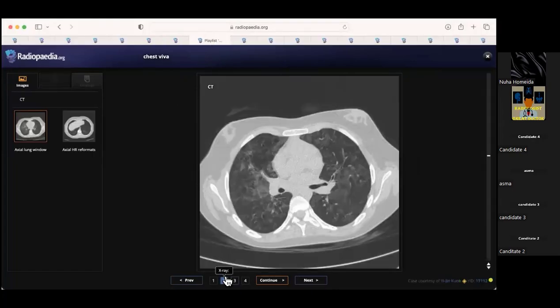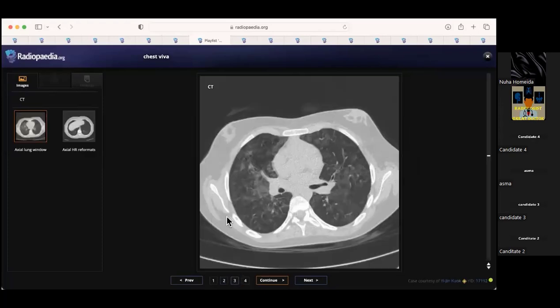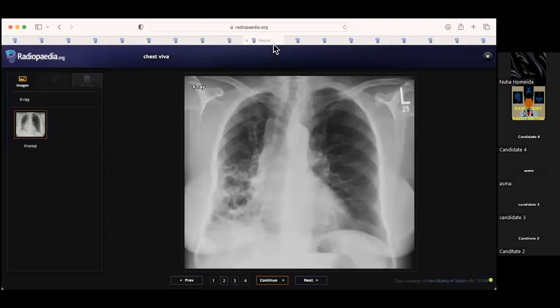This is the case of hypersensitivity pneumonitis, so perihilar alveolar infiltrate. And the giveaway was on the CT, which showed air trapping and ground glass nodules. And the management is referral to the MDT, because it needs history as well as radiology, as well as bronchoalveolar lavage and pathology.